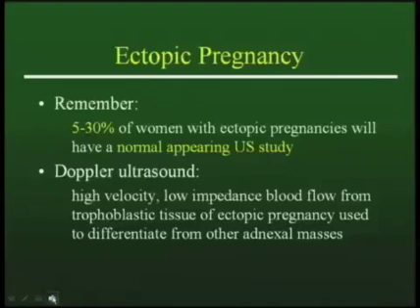Remember that a normal pelvic study does not eliminate the possibility of ectopic pregnancy. Clearly some 5 to 30% of women with ectopic pregnancies will have a completely normal appearing ultrasound study.